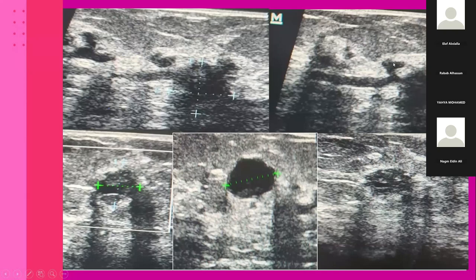And not only that, one of the anterior lobules here can be seen even involved, and so forth. Here there is another one, and we can see another one in the other image, and here there is another one. And this is another lesion here, very complex, soft tissue with a cystic component, okay? So, on evaluation we raised suspicion, this is BI-RADS 5, but we need to do MRI before biopsy to evaluate the disease extent.